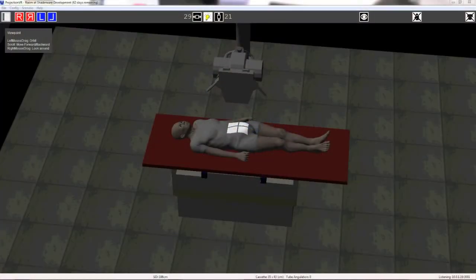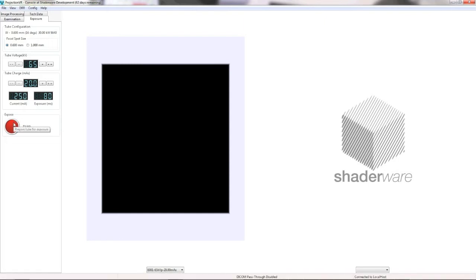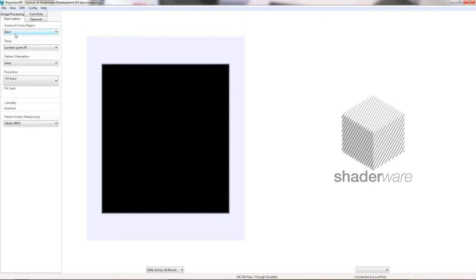Projection VR has a few other tricks up its sleeve. It has a console that allows selection of relevant studies and projections from a database of over 500. It allows students to save the virtual radiograph immediately to their hard drive for use in reports or assignments.